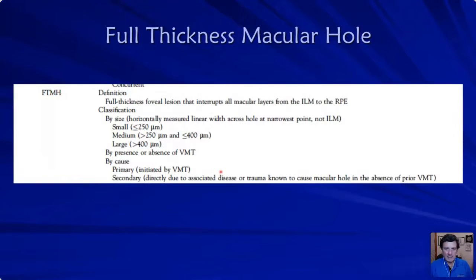So how do you get the sizes? Well, it's just based on whether it's 250 microns or smaller, that would be a small hole.